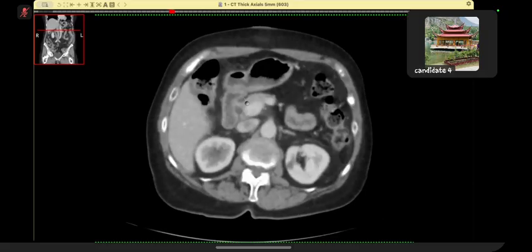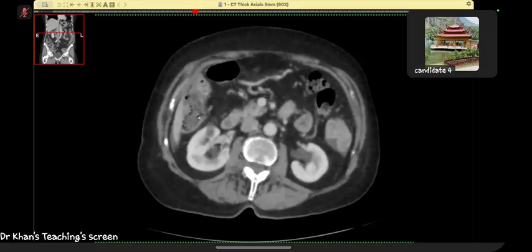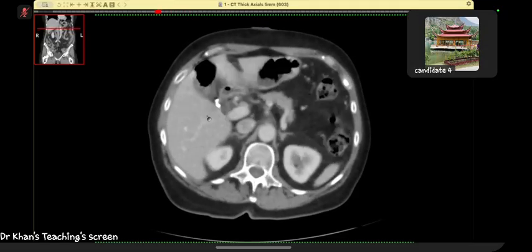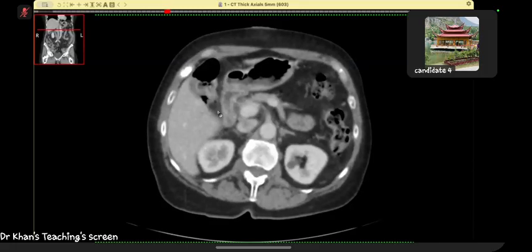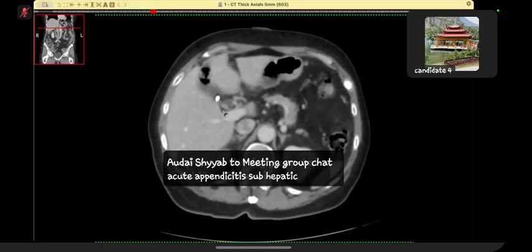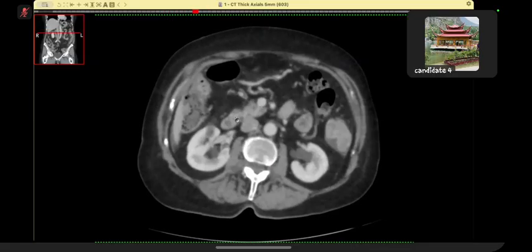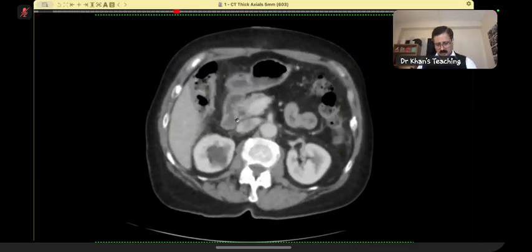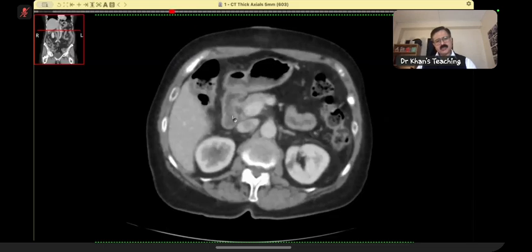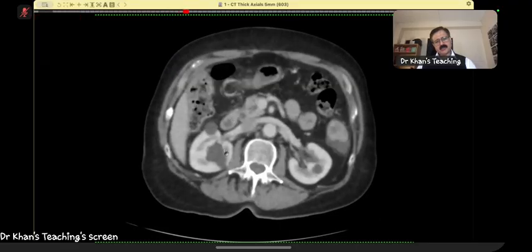Sir, I am concerned for any leak from the duct, however, I'm not able to appreciate any hint. Yes, sir. Segment 6, below segment 6. Anything you see there?